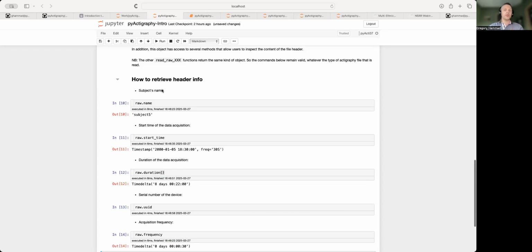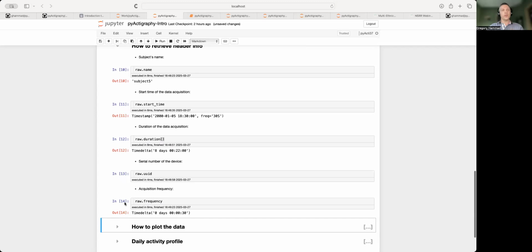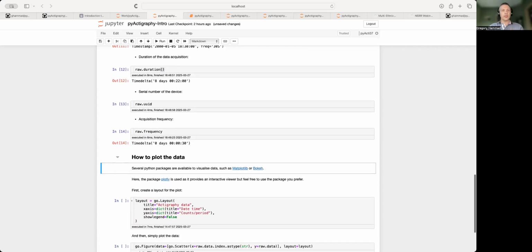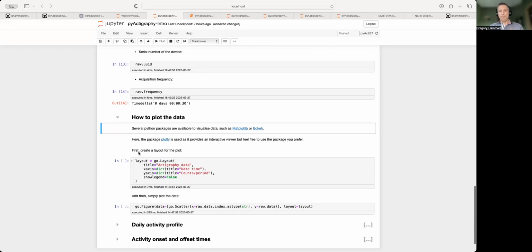Okay, so those are just information that usually are contained within the header of the different files. And actually, they are useful if you want, let's say, to perform the analysis, you need to know from which subject has been acquired. And also sometimes you need to be careful of their sampling frequency just to pool data together. Okay. Let's now move on.